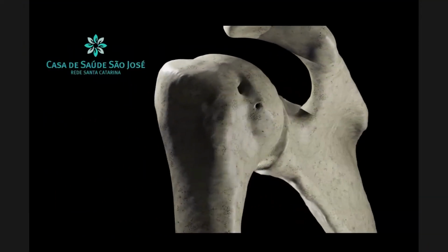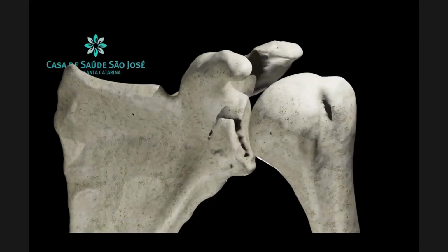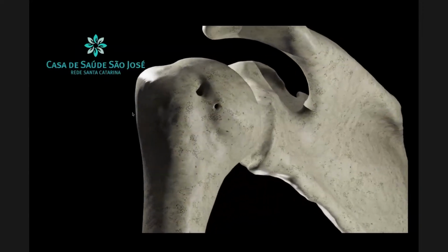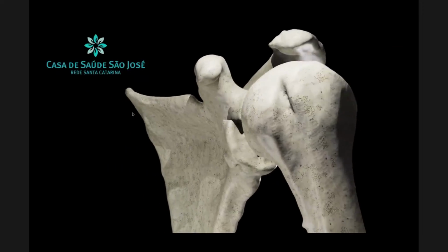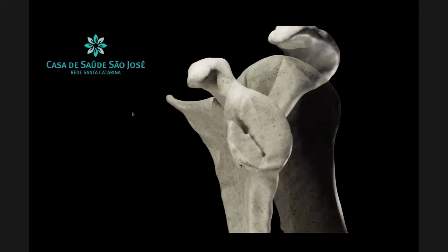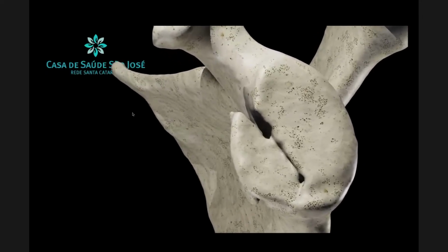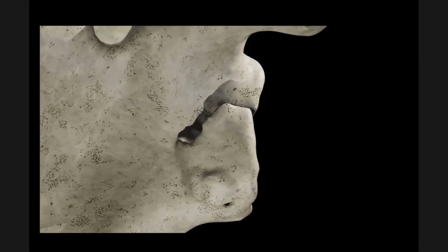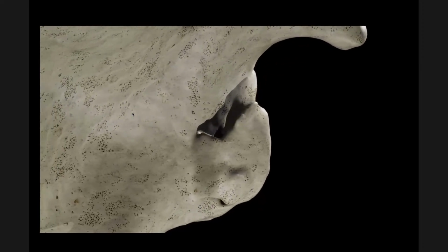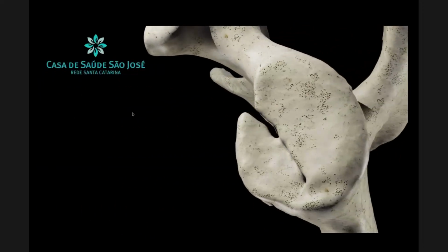So that's the result of your post-processing, right? Yes. Just let me go back here. That's the result of our post-processing. After segmenting in your software, we extract the images as STL files or as PLY files and insert them in our method to do the advanced reconstruction. Very good.